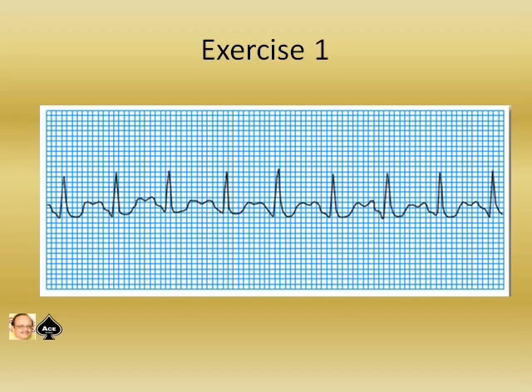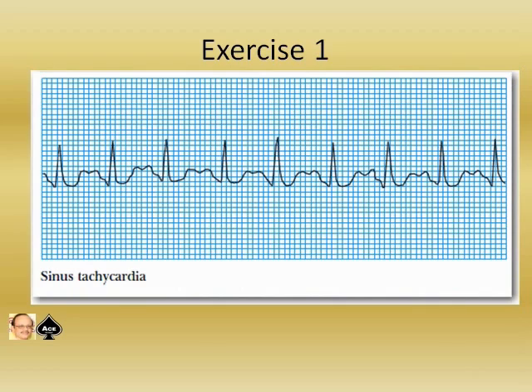Now we shall start with some exercises for just trying to recollect how far we have learned. So read the ECG and come to a conclusion. I will show the ECG just for a few seconds, less than 10 seconds. Now there is sinus tachycardia.